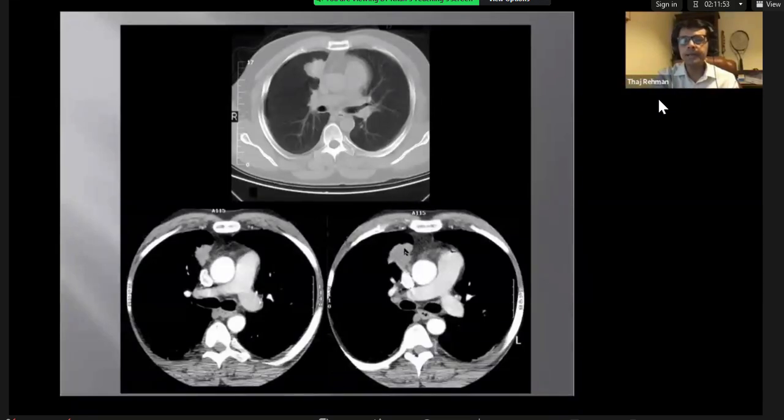And it's unusual. It doesn't happen that a mediastinal cancer originates from the margin of the mediastinum and then grows into the lung. That's not a pattern that happens. So when you see a mass like this, no need to think twice. I'll show you mediastinal cases, and that will clear your mind about when to call something mediastinal and when to call something of lung origin.